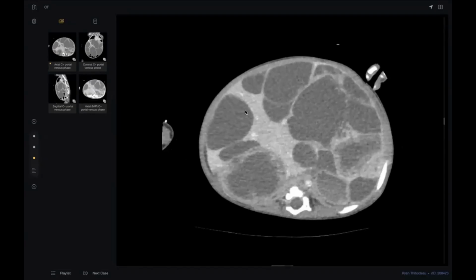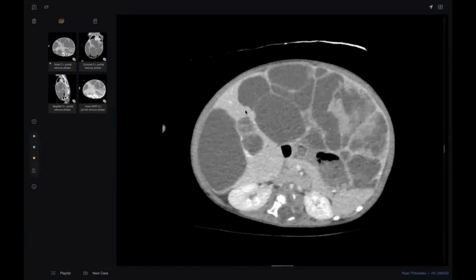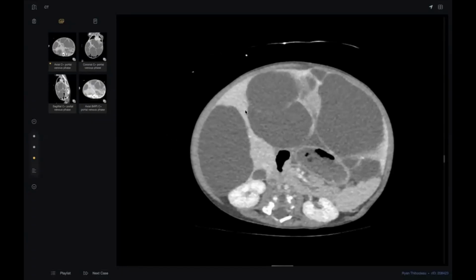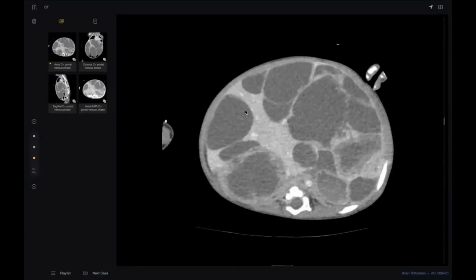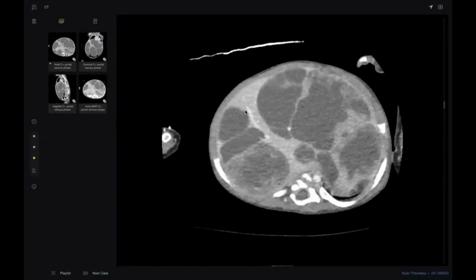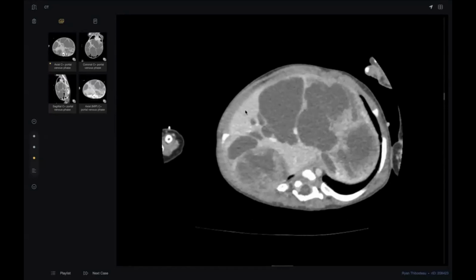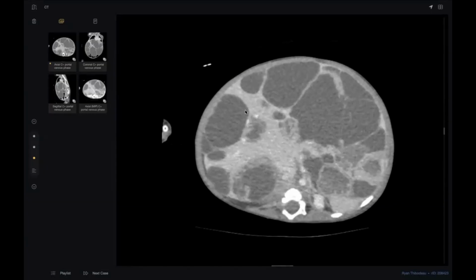How to differentiate between both of them? Sir, hepatic hemangioendothelioma shows gradual filling in the venous phase. Okay, and do you see any gradual filling here? I was suspecting it in one of the components. However, I would suggest further workup to rule out hepatoblastoma.